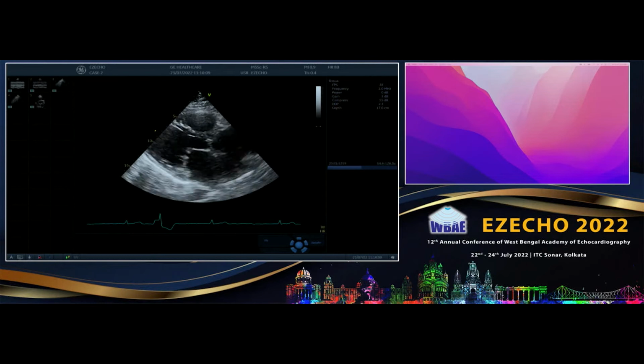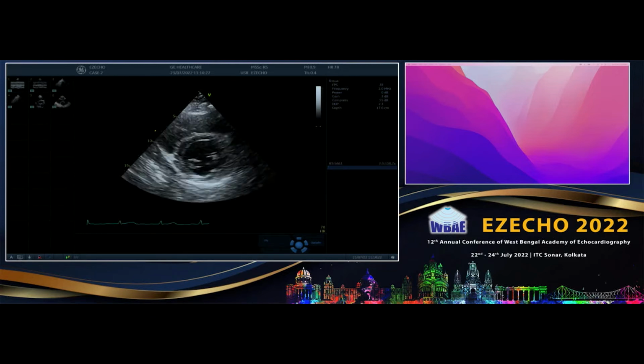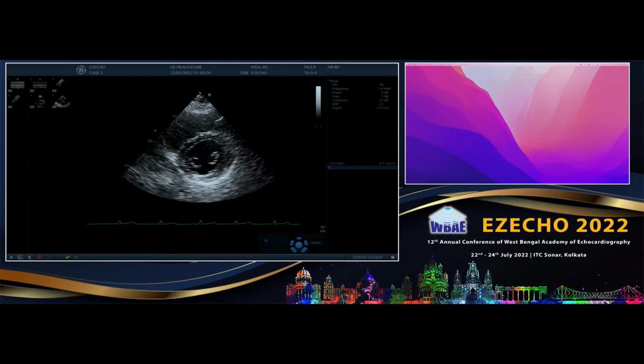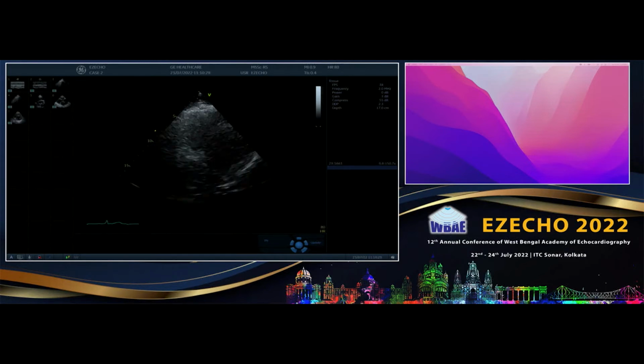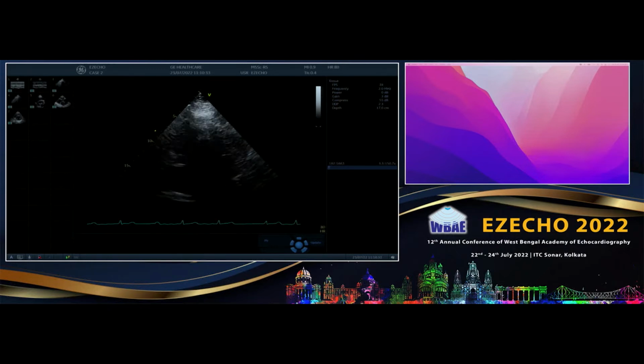And while we are doing valvular heart disease, as a clinician, I would advise that you go through everything: clinical examination, ECG, X-ray. So you know whether there is cardiomegaly or not, you auscultate for the murmurs, and then you start echo. Always start with pure 2D, do not put color Doppler. You put color Doppler when you have made up your mind, because there are simple things on the 2D.